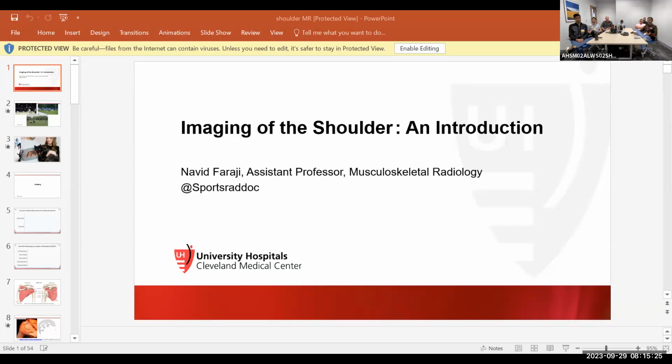On the AP, I'm looking at acromioclavicular pathology to see maybe if there's any external impingement, possibly. I can see if there's an os acromiale. The best view for that is the axillary view, in my opinion, to look for any accessory ossification sites. Sometimes I'm looking for intracapsular bodies in the superior subscapularis recess, or embedded within the long biceps tendon sheath, which is a common area for that to happen. Also, calcific tendonitis, looking for mineralization in the region of the cuff.